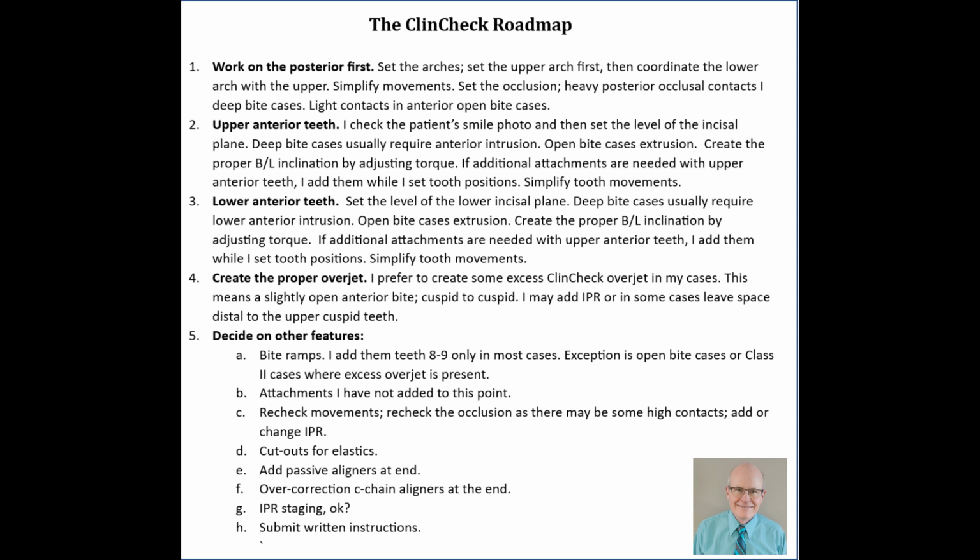I look at the buccal lingual inclination. I kind of look from the side a little bit. And if needed, I'll adjust that buccal lingual inclination by adding or reducing torque. If additional attachments are needed, I'll usually place them at the time I set tooth positions. And I always check tooth movement values and I try to simplify them as much as possible.